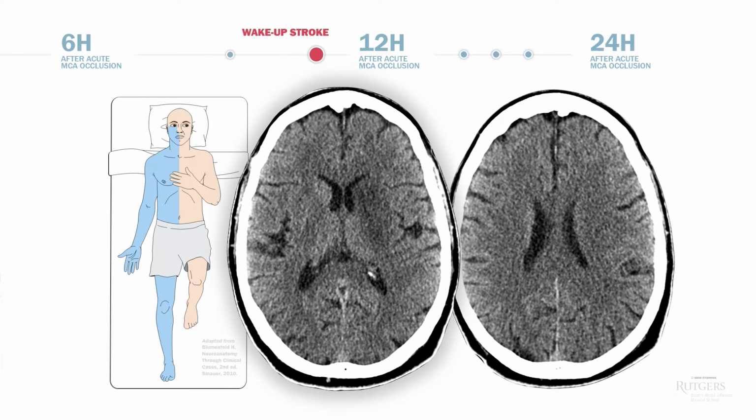What is the ASPECTS in this case? I'll give you a minute. If you find it difficult to call, you're not the only one. If you find it obvious, don't get too excited patting yourself on the back.